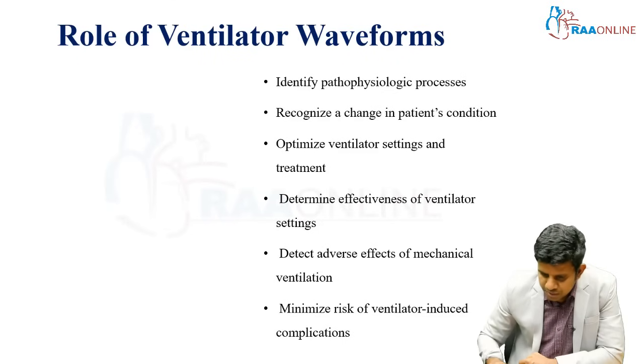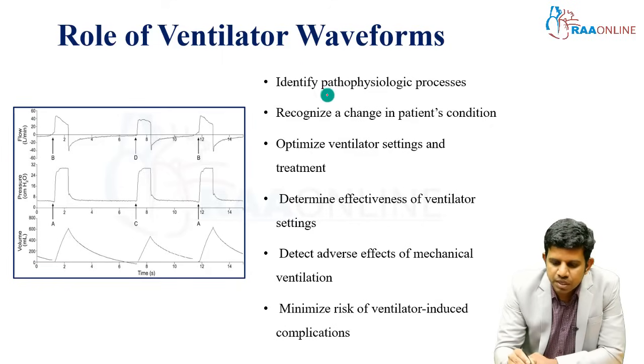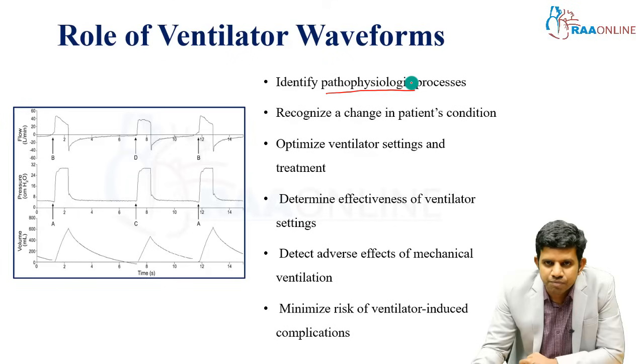Next we see what we will do with the ventilatory waveforms, and why the modern ventilators give continuous information about respiratory mechanics. From these waveforms, we can understand the pathophysiological process. Whenever a patient comes with COPD, the waveforms will be different, like auto-PEEP or an increased time constant. These are the common problems we face with patients with obstructive airway disease. If it is ARDS, the time constant will be very short. It is a compliance related problem, and our ventilatory settings will be different.